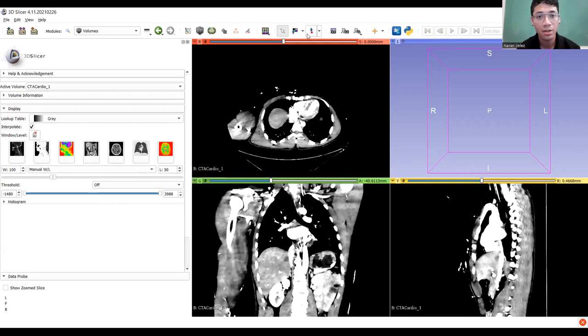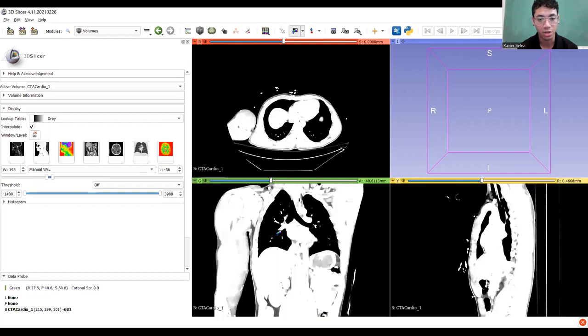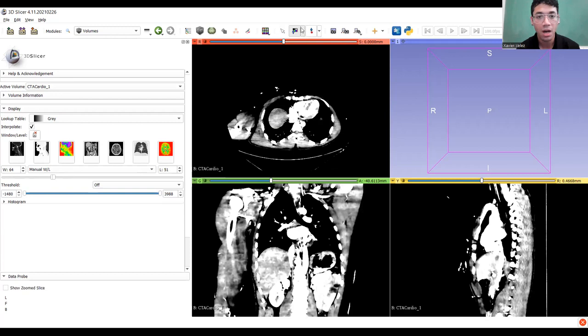Another tool up here is to manually increase or decrease the brightness. So if I click this instead of my mouse here, I'm in this little tool, and then I click and scroll up or down, I can increase or decrease the contrast that way. And you can see on the left-hand side this shift over here. So again, just different tools you can use. Don't want to spend too much time on this.